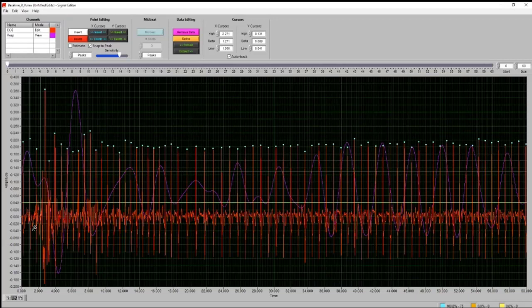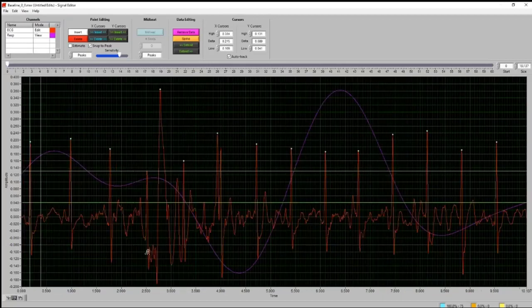So let me go ahead and use this first one. I like to initially look at about 10 seconds of data. And it certainly depends on the heart rate and the population that we're looking at, but usually 10 seconds of information is good to look at at once. So I'm going to go ahead and do that. Click and drag. From here, what I'm looking for are some fundamental components of an ECG QRS complex. And so I'm going to go over those really briefly with you.